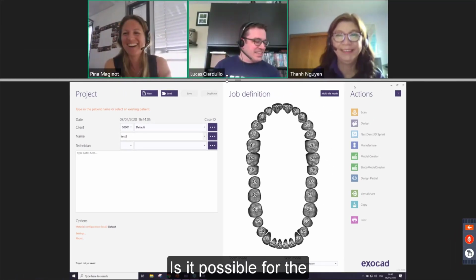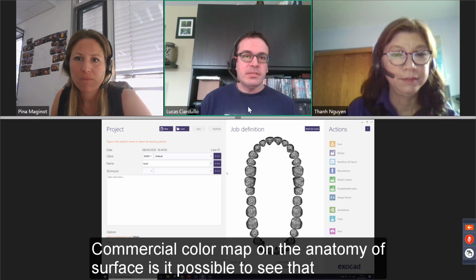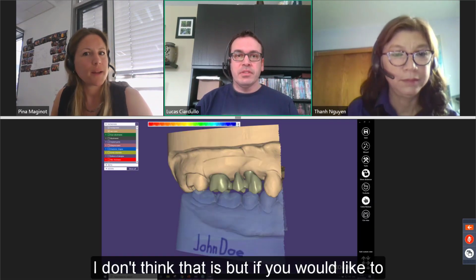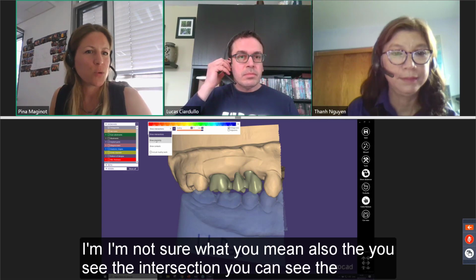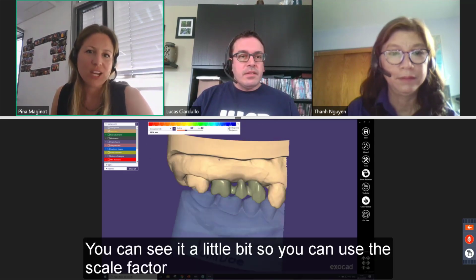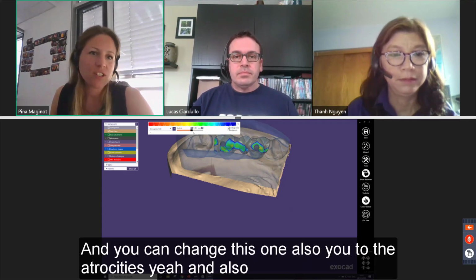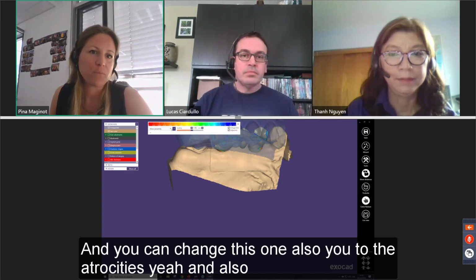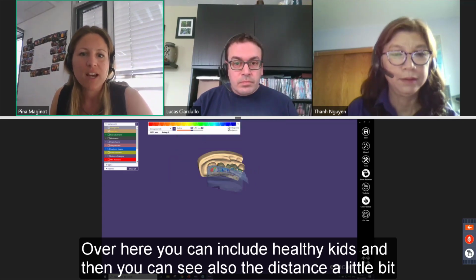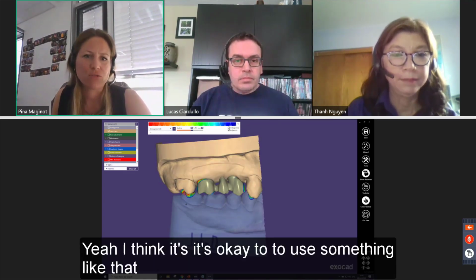Okay, so next question: is it possible for the show distances tool, where it shows the color map on the anatomy surface, to see that on copings or the substructure? I don't think that is, but if you would like to. I'm not sure. You mean you see the intersection. You can see the context, and here you can see it a little bit. You can use the scaling and the factor, and you can change this one. Also, you do the adjacencies. And also over here you can include the healthy teeth, and then you can see also the distance a little bit, and you have a color mapping also. Yeah, I think it's okay to use something like this.